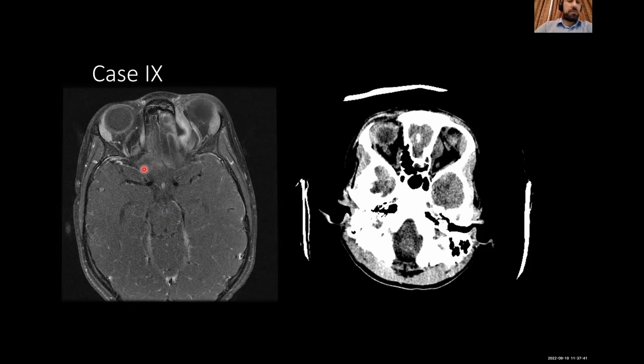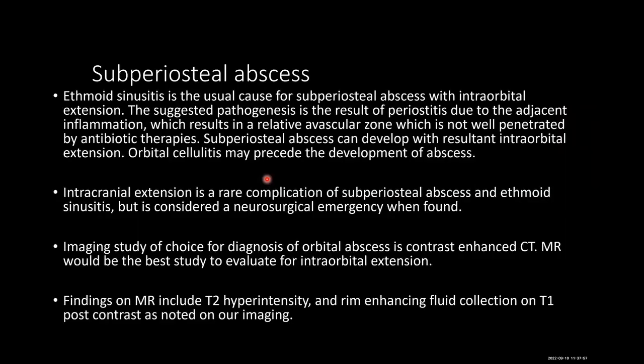Yes, great. Yeah, here it is. This zone. Subperiosteal abscess comes from the most common infection, from the ethmoiditis. Subperiosteal abscess and ethmoid, the most common reason is ethmoid sinusitis. It can have intracranial extension, which is a bit rare, but can happen.